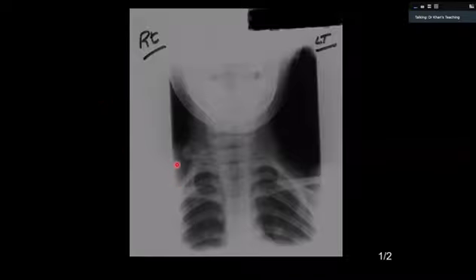What do you think is this, where I am pointing out? Oh, that's the right scapula, is it? Yes, so it's connecting the right scapula to the 7th vertebra, which would be in keeping with it, and the scapula appears to be elevated, so it's a Sprengel deformity. Okay, that's fine. Well done.